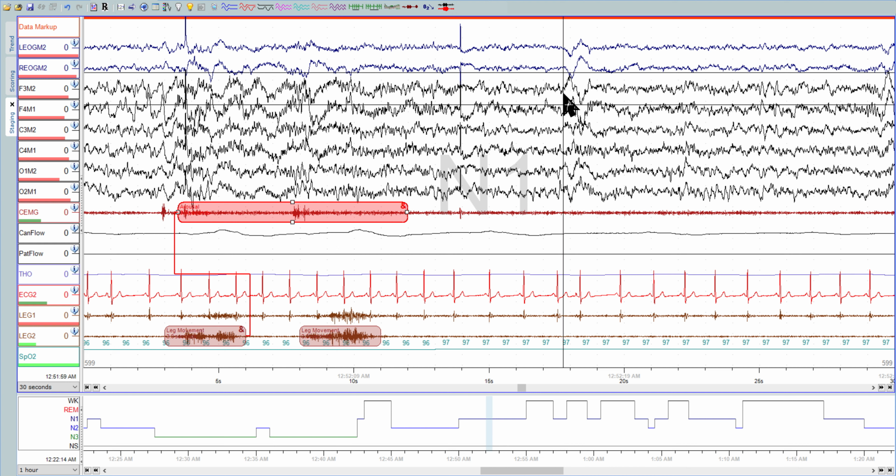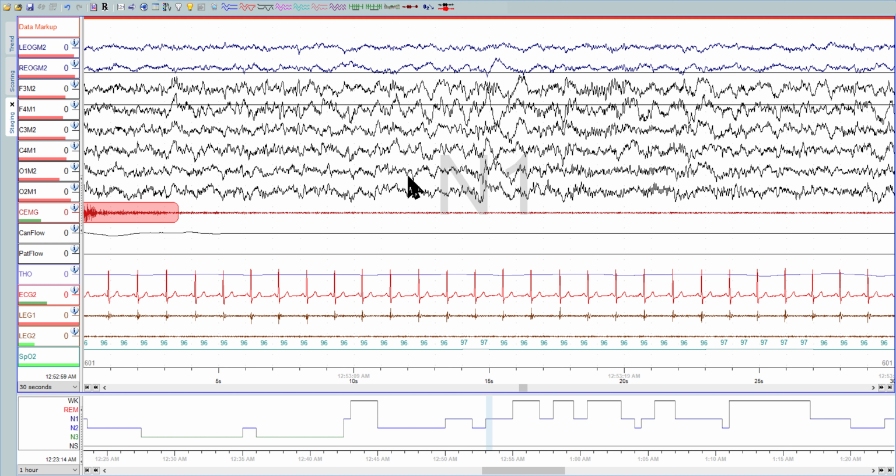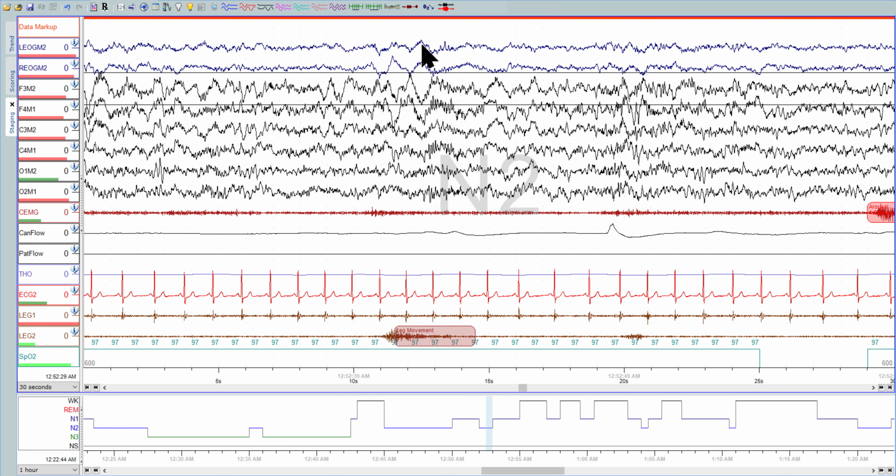Actually, this one would be two. Actually, K complex here, so you have 12.5 seconds of two and 5.5 plus 3.5, so 9 seconds. So that one would be two, good. Oh, I changed that to two actually. Got plenty of K complexes in this one.